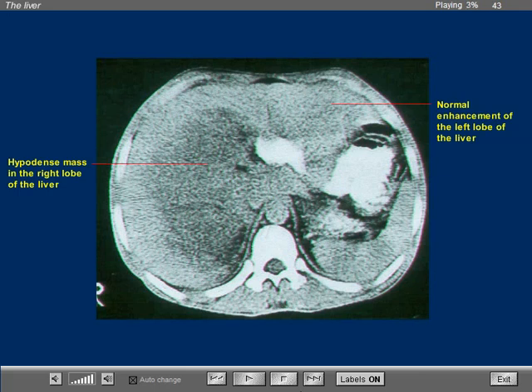This is a CT examination of a professor of radiology who noted the presence of gynecomastia. He was not taking any hormonal medication or any type of medication such as digitalis to explain the gynecomastia. One of the considerations when a male presents with gynecomastia is a functioning endocrine tumor, and one should always look for the possibility of an adrenal tumor, and particularly for a carcinoma of the adrenal gland.